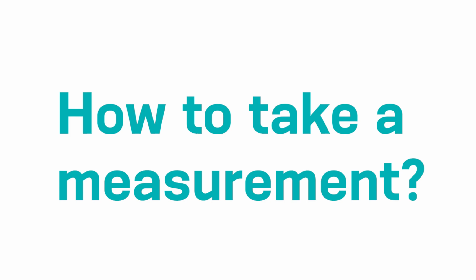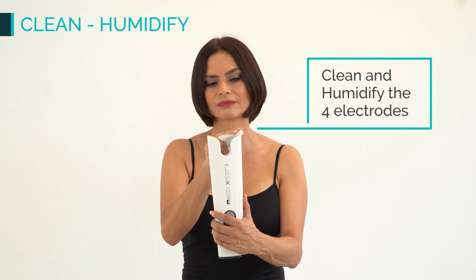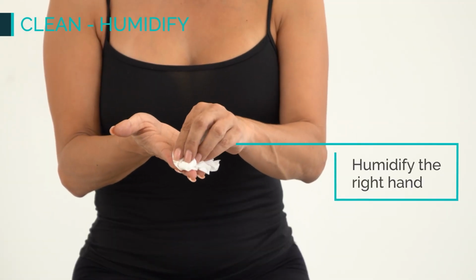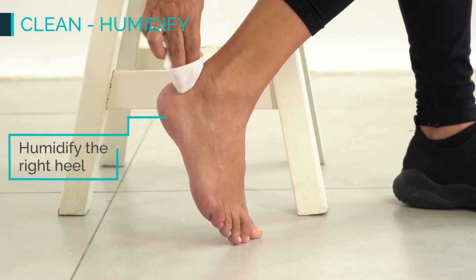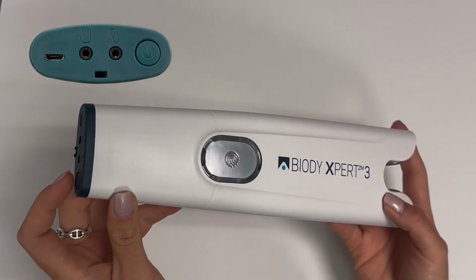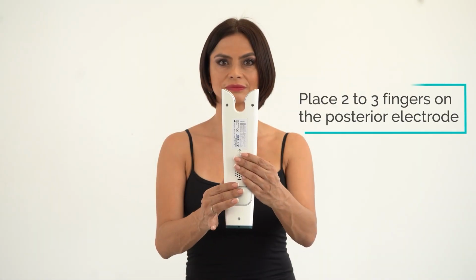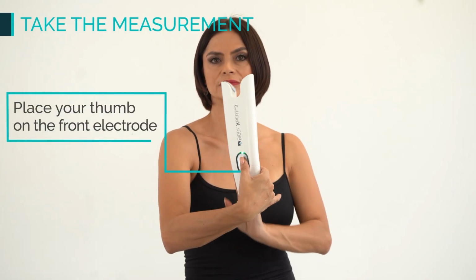How to take a measurement. Make sure that the electrodes of the device are moistened. Slightly moisten your right hand and right heel. This will ensure better conductivity and more accurate measurements. Turn on your device before taking the measurement. Place 2 to 3 fingers on the back electrode and place your thumb on the front electrode.